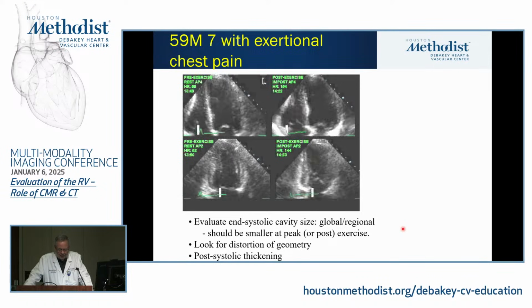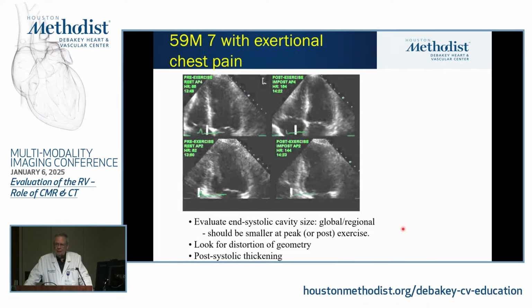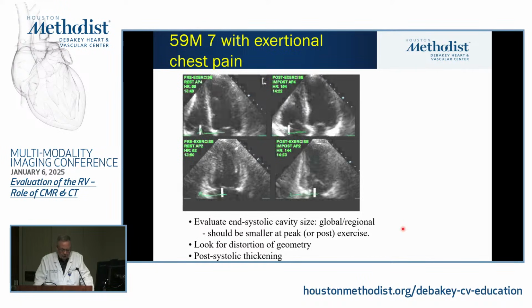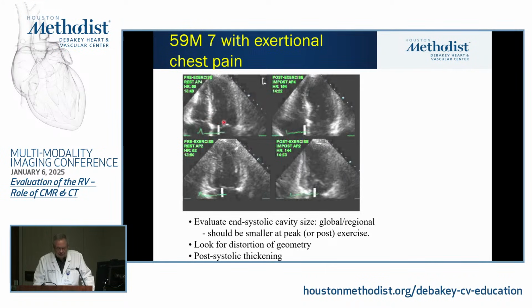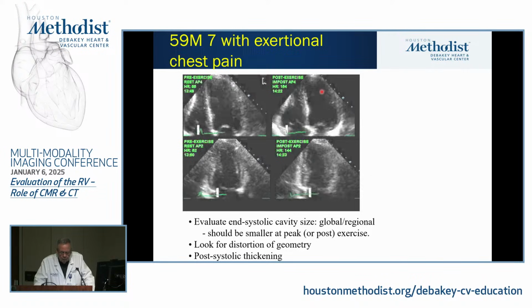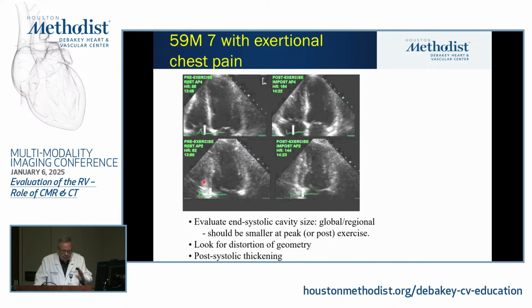That's okay. For those who voted abnormal, is it LAD? Circumflex? RCA? So what is it? Okay. I can see where, yeah. These are all contrast studies, and it's a nice example of why we use more contrast these days. Yeah, I can see that for you, this area here is hard to pick up. But actually, the very definite abnormality is here.